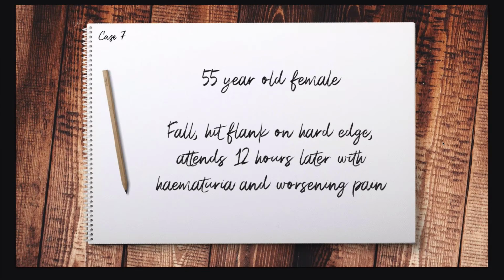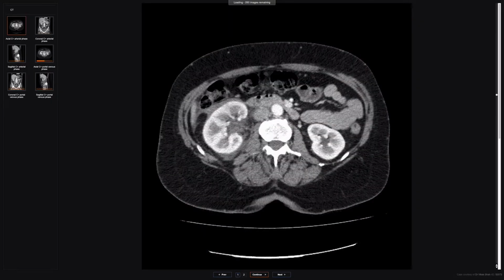Right, so the next one, again, we're thinking about multi-phase CT now, okay? 55-year-old female, so trauma, fell, hit her flank on a hard edge, attended 12 hours later with hematuria and worsening pain. So we've got this study which is split into two separate portions. But in your practice, I want you to try and do this in one, okay?